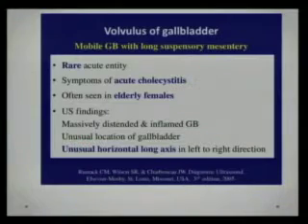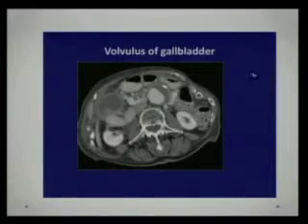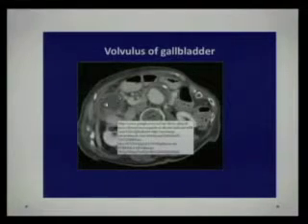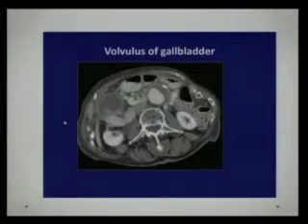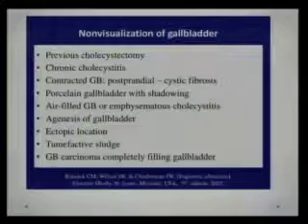And what do we see? We see a massively distended and inflamed gallbladder like you see in any patient who has acute cholecystitis, but the gallbladder location is funny. It's not in the expected location of the gallbladder, and the unusual horizontal axis or horizontal orientation of the gallbladder is what gives you the clue to this diagnosis, as opposed to the oblique orientation of the gallbladder. I couldn't find an ultrasound image, but this is a patient, I think from Radiographics or something, where you had the fundus this way and the neck this way in a patient who has gallbladder volvulus, which is folded upon itself like a mirror image.